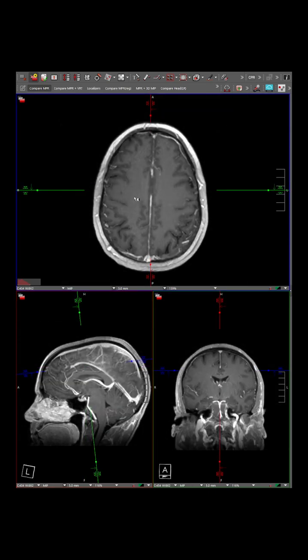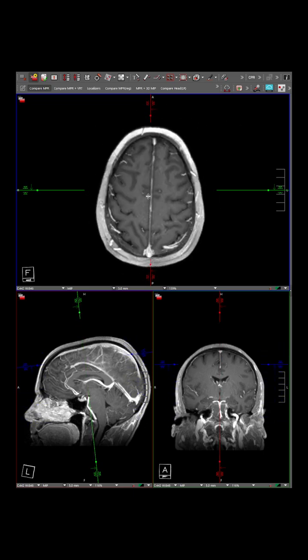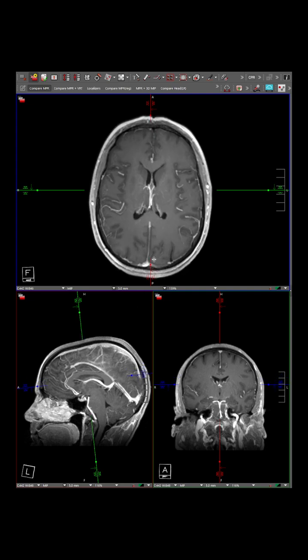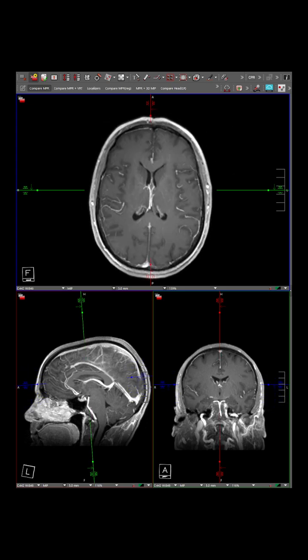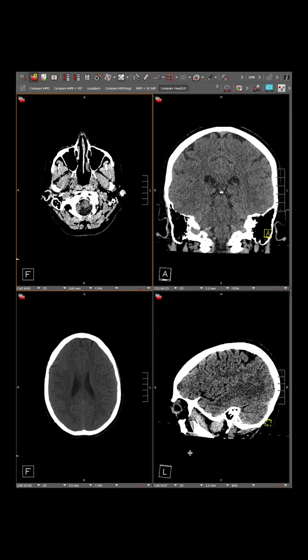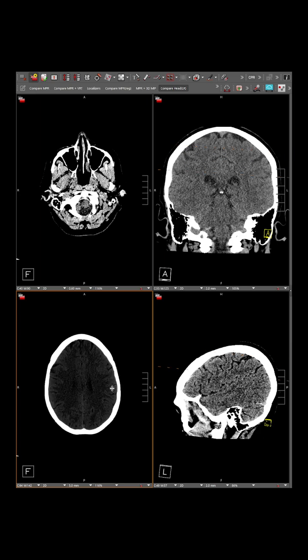When I'm looking for brain mets, I'll be using medium thickness MIPs in some cases to look for enhancement. I should note, if you compare, let's go back here, the thick reconstructed images, if you scroll through these, you see how they jump. They're book-ended, right?